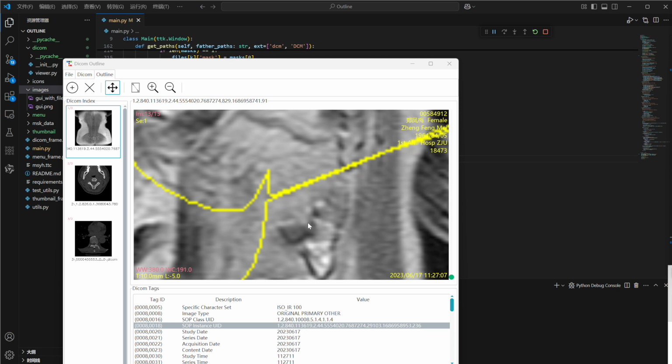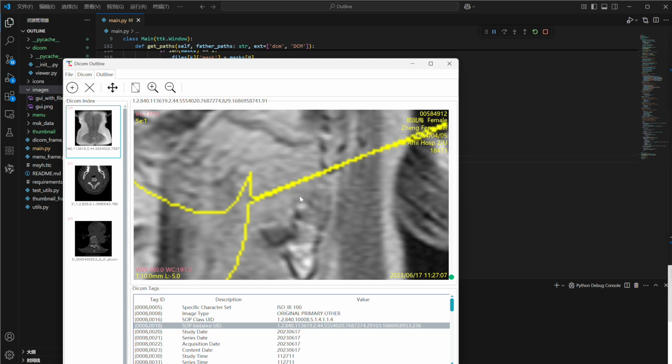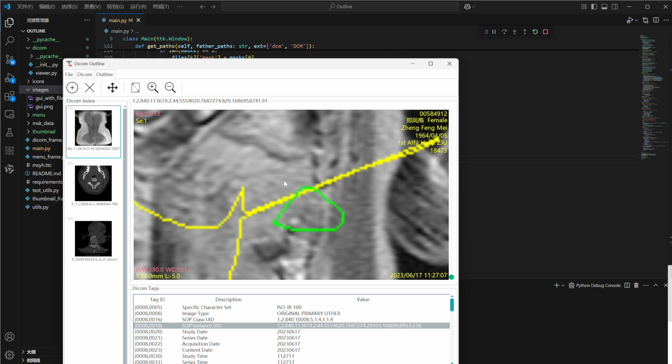If you try to move to another image without saving, the program will prompt you. Clicking Confirm will save and move on, Refuse will skip saving and move forward, and Cancel will take you back to the current file.